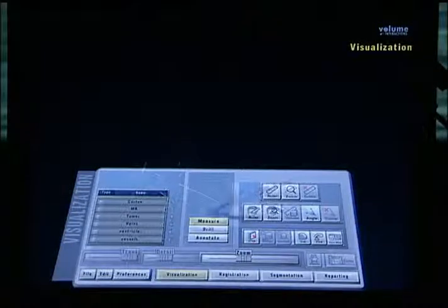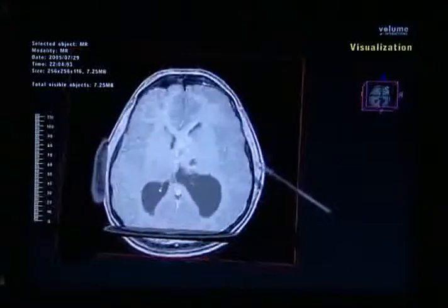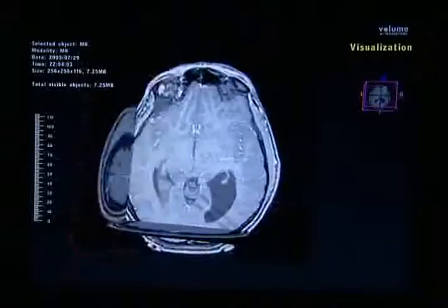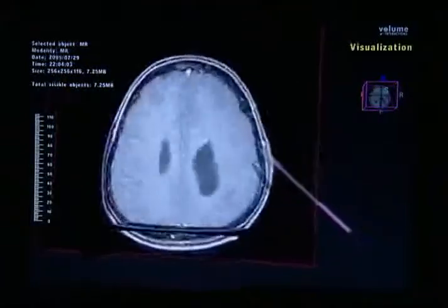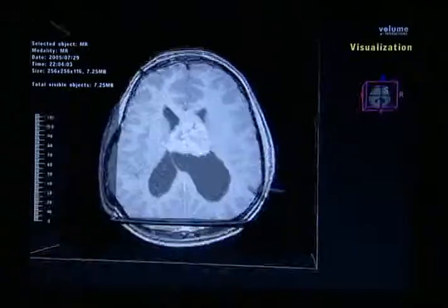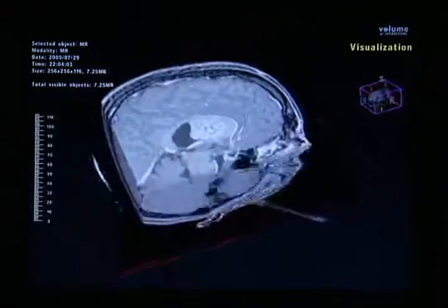This is a 19-year-old male who presents to the ED with symptoms of hydrocephalus. He gets a CT scan, and he gets taken right from CT by the resident to the MR, where he gets fiducials placed on his head in preparation for a navigated approach to this lesion, whether it's Stealth, BrainLab, or another system. And this is what you can see: he has an intraventricular tumor. The pathology was neurocytoma. This is what the tumor was.